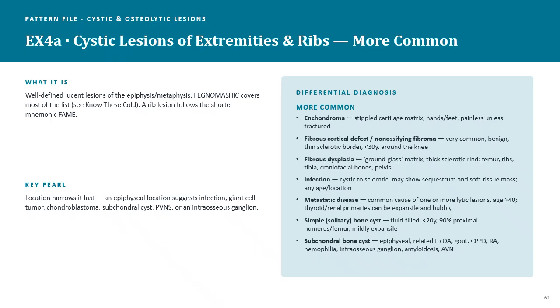One of the important things about the cystic lesion is the border. A cystic lesion will often have what they consider a smooth, clear edge, a well-defined border, and that tells the doctor or the radiologist that whatever is there is growing a lot more slowly, and the bone is having time to somewhat form a boundary around whatever is foreign or whatever is attacking it.